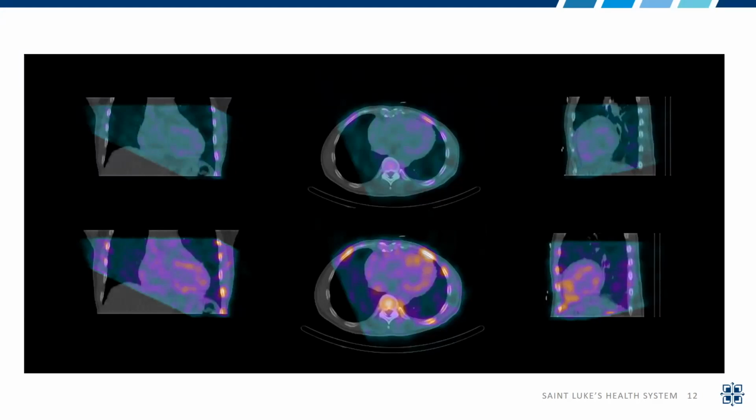Instead, what you really see is more increased uptake in the bones on the scan itself. The soft tissue in the blood pool is relatively constant between the 1 hour and the 3 hour for the most part. And in this case, you really have to change the scaling to look at the picture to make sure that what you're seeing truly is myocardium and not blood pool. And also having the CT scan in a lot of cases and being able to accurately register those images with the CT can help with the processing and the interpretation.